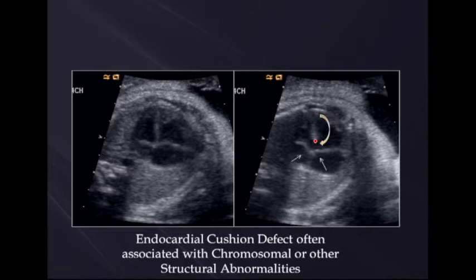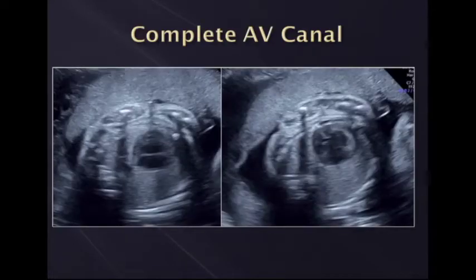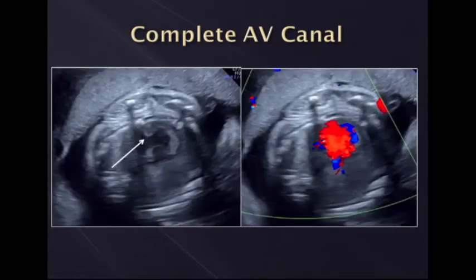Also, often these little ends of the ventricular septum where there is a VSD will appear bulbous or almost light bulb in appearance. Here's a complete AV canal, and you can see here between opening of the valves and closing of the valves, you get that complete T appearance, and you can see there's no ventricular atrial septum here, a fairly large AV canal. Here's another complete AV canal, and you can see sort of this bulbous appearance. Some people say it's a light bulb appearance, but you can see where the ventricular septum ends when there is a large ventricular septal defect or an AV canal.